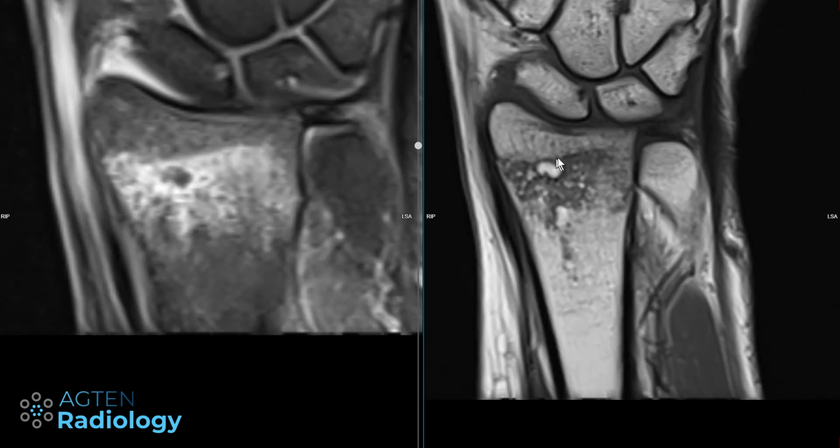So we have fat within the bone, and it's nothing new, we have the fatty bone marrow, but this is something that looks like fat globules, and this can actually happen. It's sometimes called the fat globule sign, which can also be seen in osteomyelitis, but not exclusively.